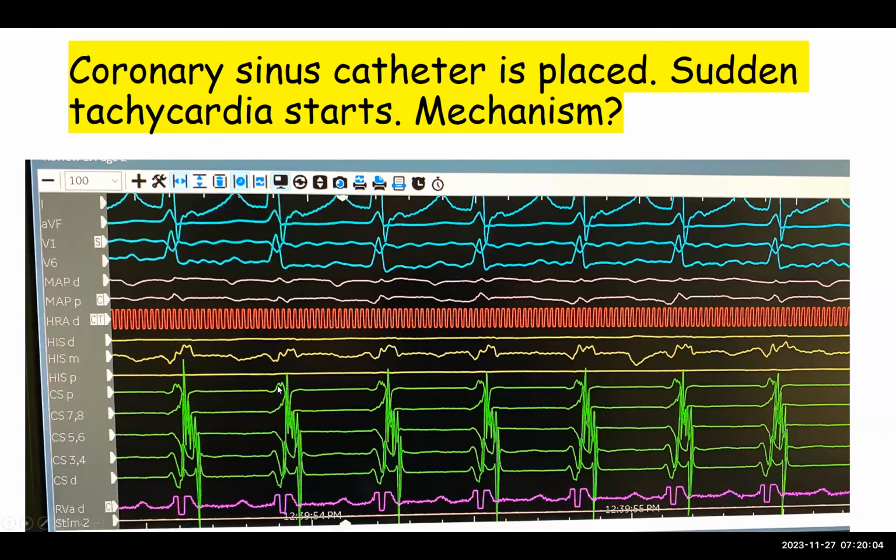So now one of the ways that we could also check to see if this is AVNRT, we haven't discussed this very much, is that in AVNRT or ORT, the R to R interval seems pretty fixed. But it turns out that in AVNRT there is what we would refer to as cycle length oscillation, meaning that if you measure the R to R interval in a patient with AVNRT, there's often between 5 and 10 milliseconds of interval change between each one. Whereas in ORT, it's anywhere between 0 and 2 or 3 milliseconds, much more fixed. Clinically, they both look fixed, but a little clue is to look for cycle length oscillation.